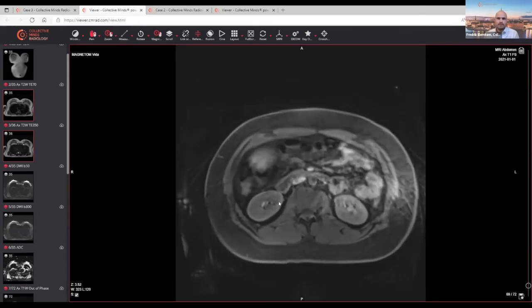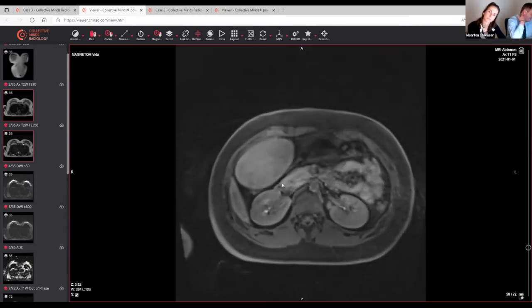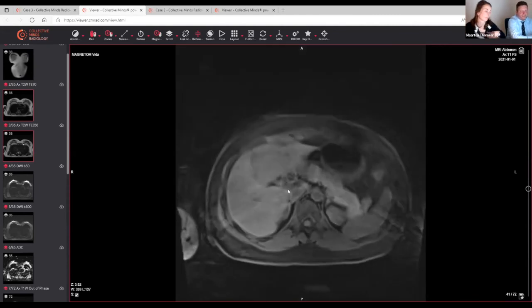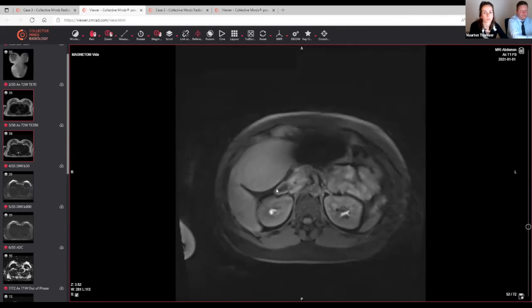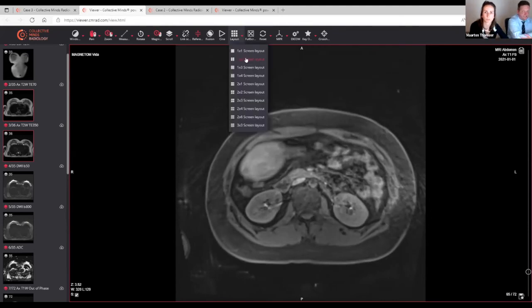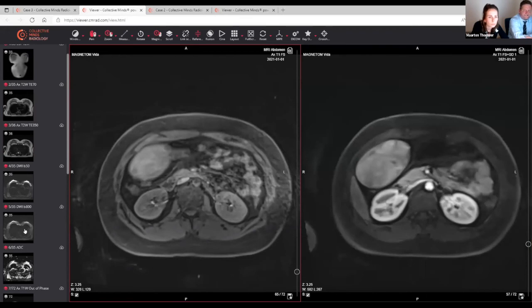There are some regions which are hyperintense. If there is hyperintensity in the lesion, and it's a real hyperintensity, look at the in phase T1 maybe. Can you look at the T1 in phase? Because that's the basic sequence. There you can be sure about the different intensities.